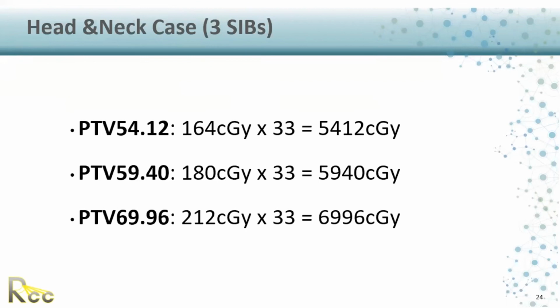My advice for head and neck cases is to use 3 arcs: 2 full arcs, and the third one with a 90 degrees collimator rotation. The third one will do fine tuning. It will make the splitting. It will make the MLC go in the same direction as the trachea itself, and it will remove the dose from the spine. It makes your PTVs not touch each other in terms of dosage.